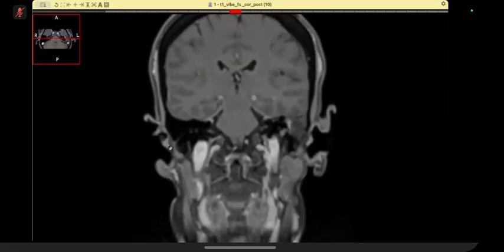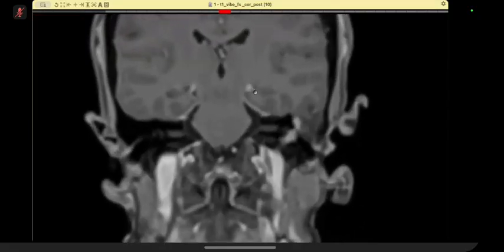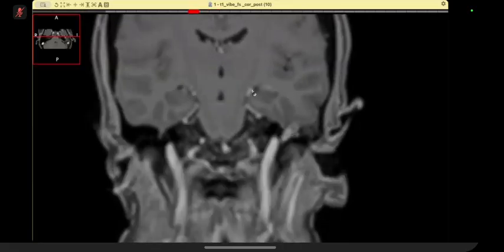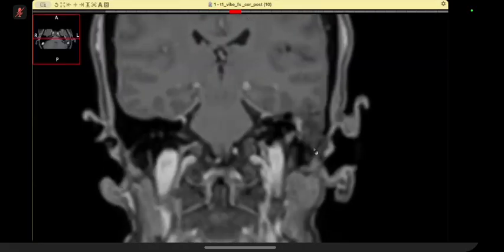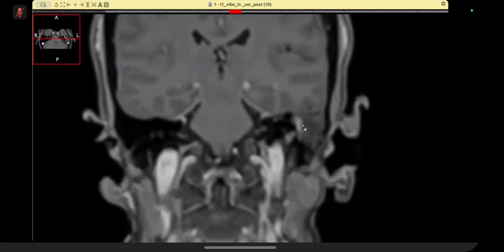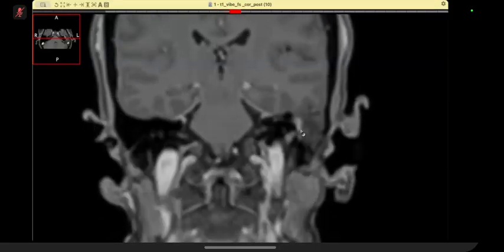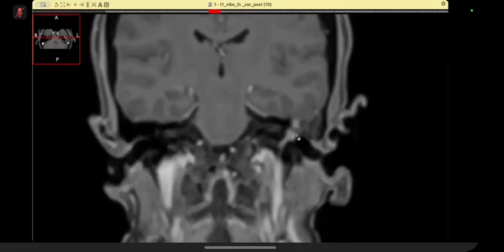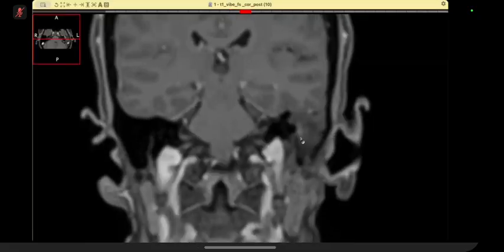And the key thing was to understand the anatomy of it. Now, if you look carefully, you will convince yourself. Do you see that this is brain parenchyma? And you can see that the meninges are involved. So you could have asked for a coronal sequence to confirm that diagnosis and how it is going down here also. Sort of a tail sign type of a thing.